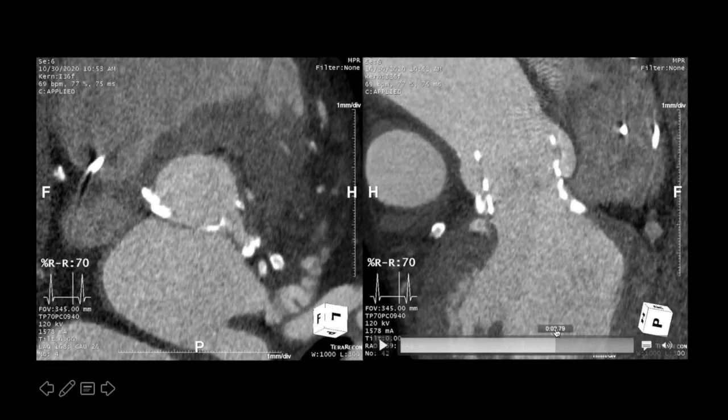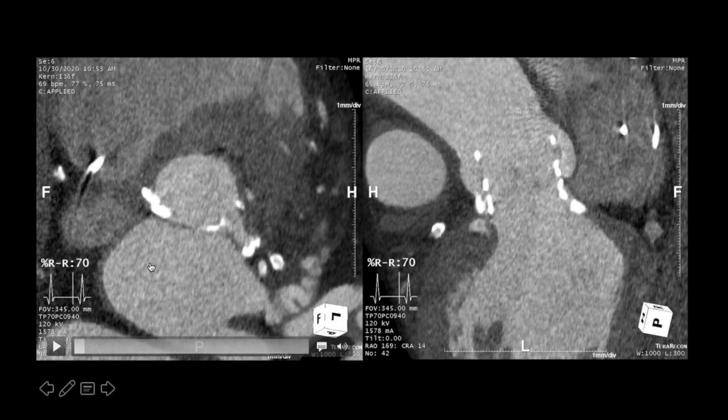So this was managed conservatively. He had 2 CTs about a week apart and didn't rebleed. And we presumed that that was the source of the tamponade. And I do think that he was discharged from hospital and is doing okay, but that was about a month ago. So we'll see what happens in the long term. So focal tear right at the annulus.